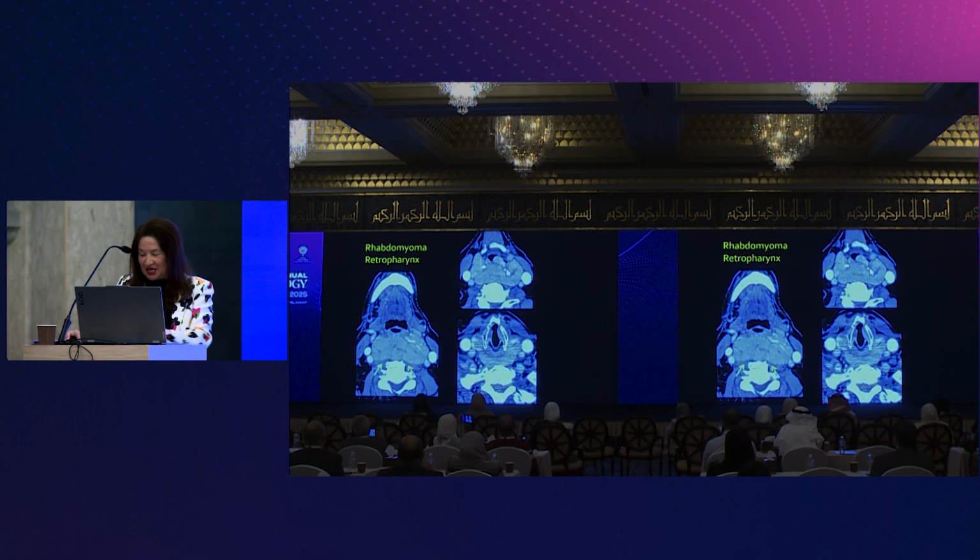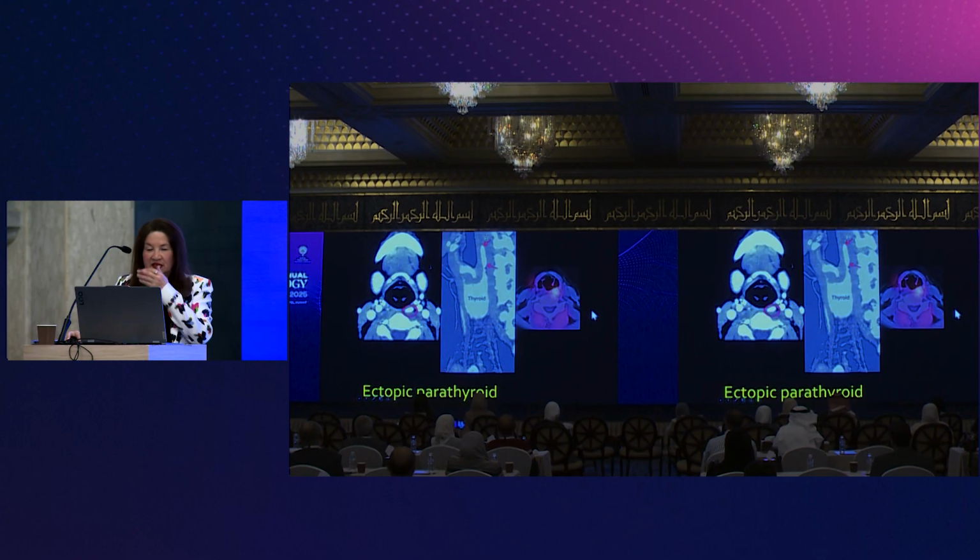So this was sort of an interesting case. I biopsied this. This was read as a thyroid gland, but it's not an enlarged thyroid gland. The thyroid gland is connected at the isthmus anterior to the airway. This thing is crossing the midline, so I knew it had to be coming from the retropharynx. You can see the prevertebral muscles behind it and the pharynx being elevated, and this was a rhabdomyoma that I actually biopsied very easily from the neck. This is an ectopic parathyroid adenoma, so occasionally you'll see one of these up here from the superior gland, and this is it confirmed on the Sestamibi study.